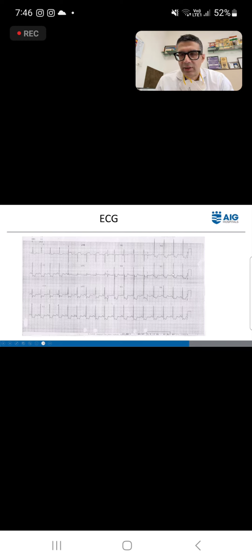So would someone like to read this ECG? Anyone can read the ECG. Dr. Rahman, would you want to read the ECG?